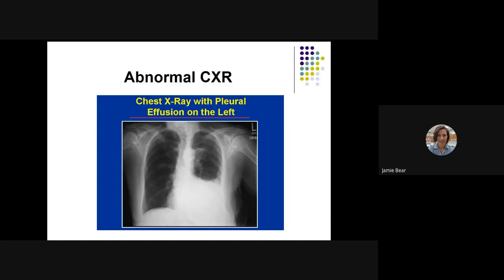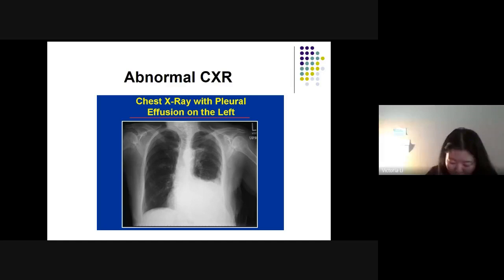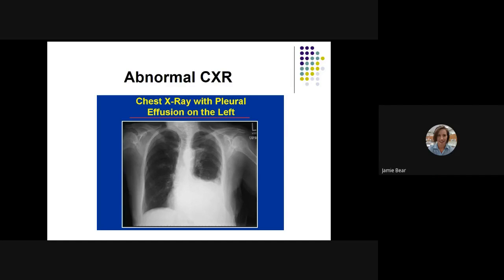Chest tube, exactly. Yep. So this is where if this patient was in your unit, they were brought in, you put them on oxygen, okay? You put them on a lot of oxygen and then they're still having problems. This is where you guys would help out with conscious sedation. So this is where you might put the patient on the capnography, and then the doctor will sedate the patient and put a chest tube into the posterior side of their thoracic cavity to drain all of that extra fluid.